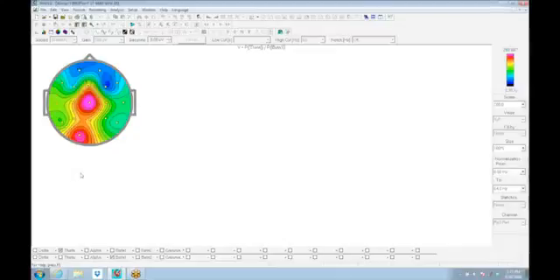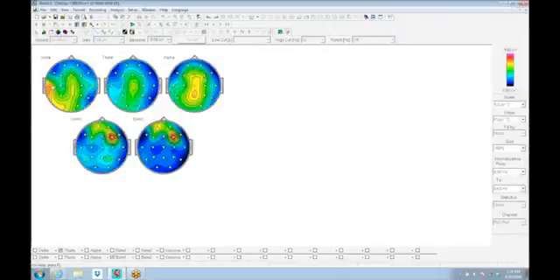Now, most people's definition of theta doesn't go all the way up to 8. It stops at 7 or 7.5. And again, to match and get what is the theta-beta ratio in the literature, you end up having to make sure that your setup file matches. You can see there's a lot of flexibility here. This can give you maps. These are big broadband maps: delta, theta, alpha, beta 1, beta 2, as defined in that setup.